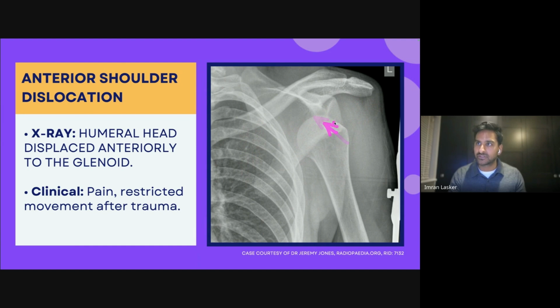You see the little nails going into there like that. And I don't think they do too much with regards to the Hill-Sachs injury. But it's also important to remember that when you get someone who's got that many Hill-Sachs injuries or that many fractures and that kind of thing, then they may end up having rotator cuff injuries as well. So these are the ligaments that go all the way around and hold everything in place.